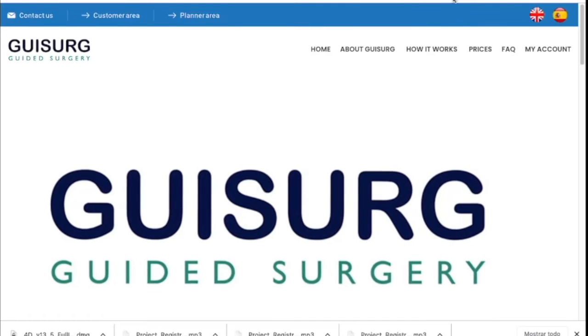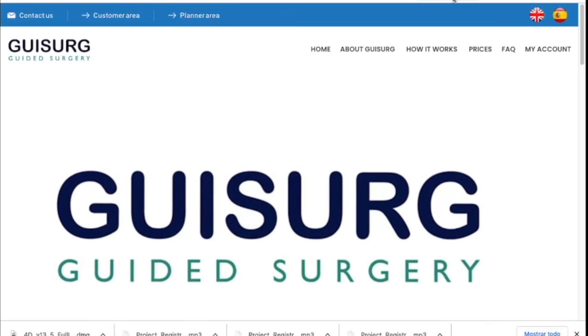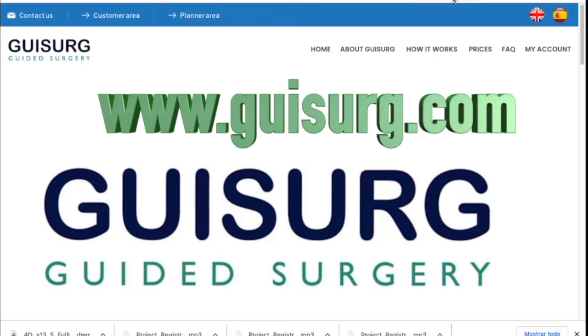In this video we are going to show you how to register on the Guisurg website, and how to place an order for an implant-guided surgery planning and splint. We will also see which files you should send us and how to do it.